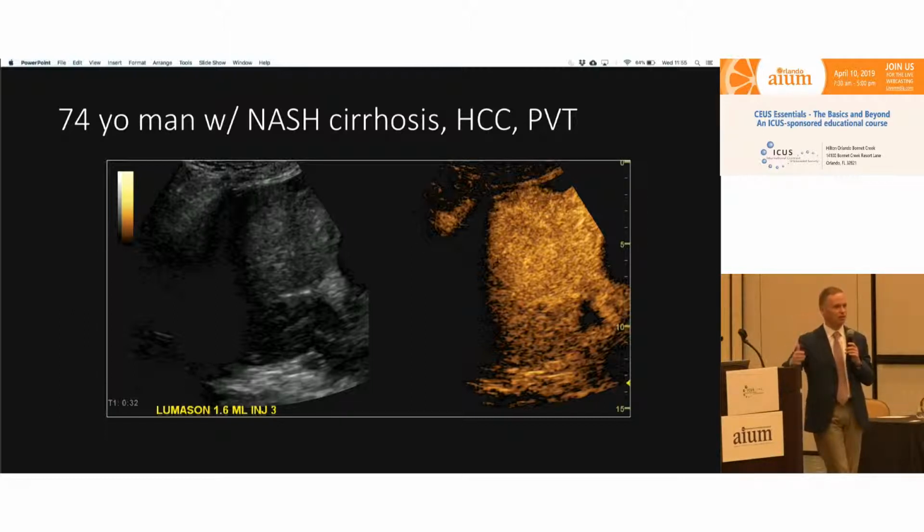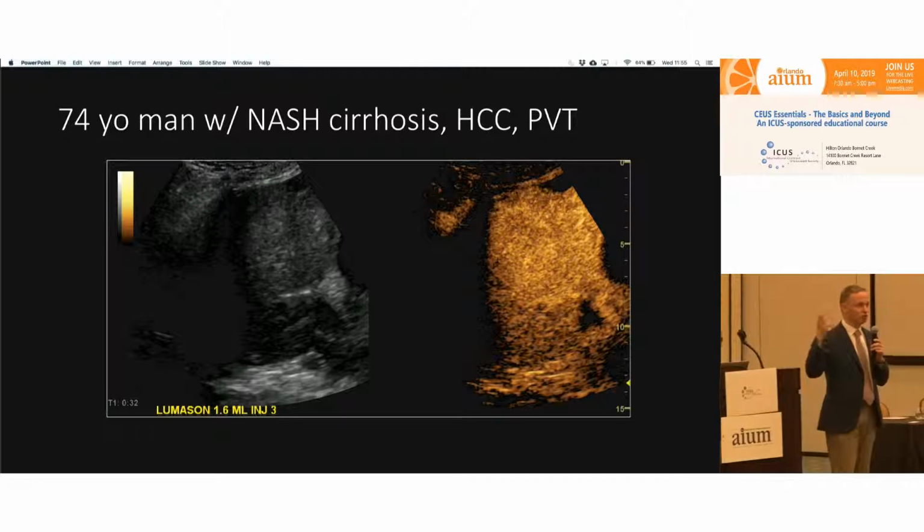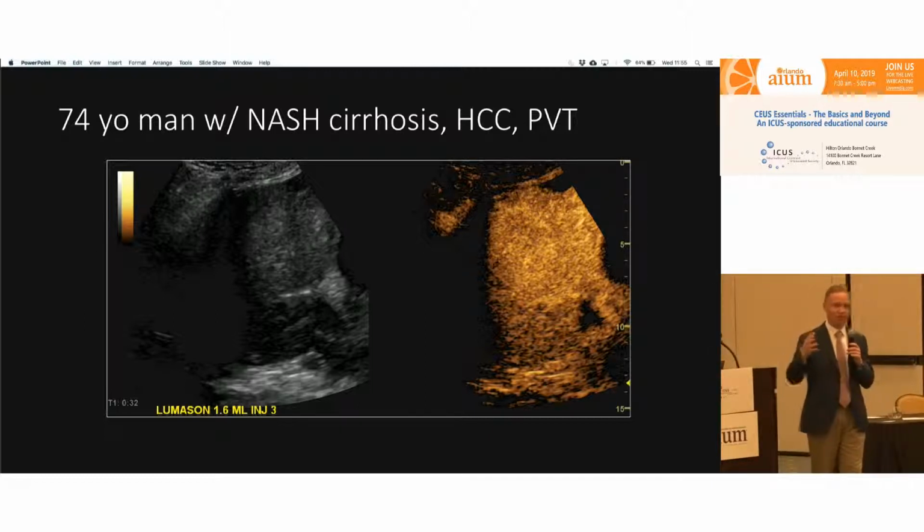So when I see the first bubbles, patients already took a breath in and he's holding. In the beginning, we would ask patients to take a breath in after we inject contrast, and by 15 seconds after contrast injection, they run out of breath. And when I need to get those 5 seconds of early arterial phase hyperenhancement, they start breathing, catching their breath, complaining about how inhumane I am by asking them to hold their breath for so long.